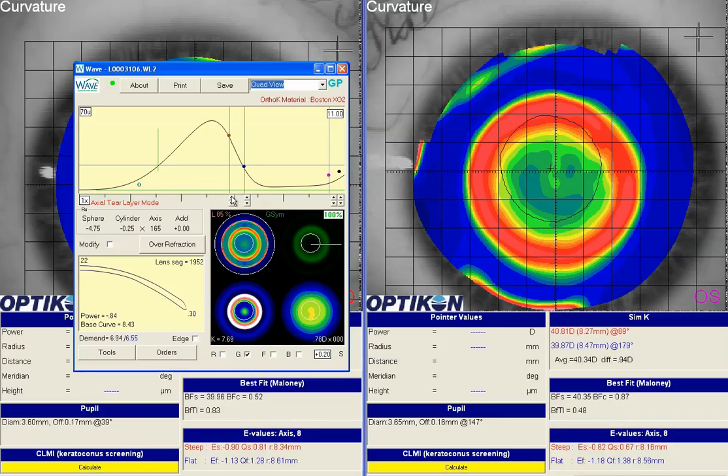And it looks like we're straddling 6.9 by 0.04 on either side right now. So I will also go to 25% mode and check the other meridians. So right now at approximately 6.9 demand in the horizontal meridian, we're at a power of minus 0.84, and now we're at 78, so we can probably make that a little bit closer.